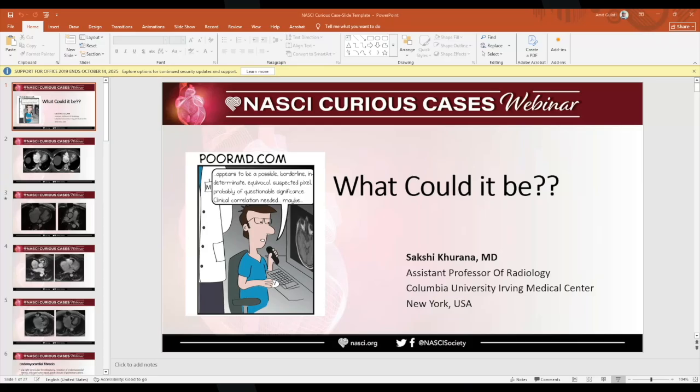So these findings were reported, and then the patient underwent a transthoracic echocardiography to further confirm the findings. Which concurred with our findings: the right ventricular size was moderately increased, function was at least mild to moderately reduced, and there was an echogenic mass in the mid to distal right ventricle that appeared to occlude most of the right ventricular cavity. The mass also appeared to affect the tricuspid valve closure, which resulted in significant tricuspid regurgitation and right atrial enlargement.